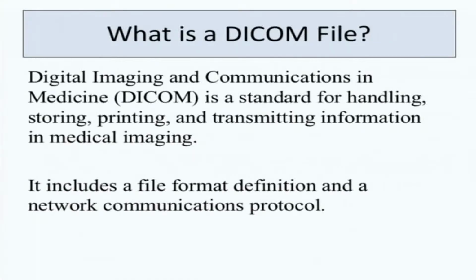So what is a DICOM file? It's basically a medical format, just like we have the JPG file. This is a separate format. It's called DICOM, Digital Imaging and Communication in Medicine. So all our medical files generally are stored in the DICOM format, and it's very easy to process DICOM files rather than processing other kinds of files.